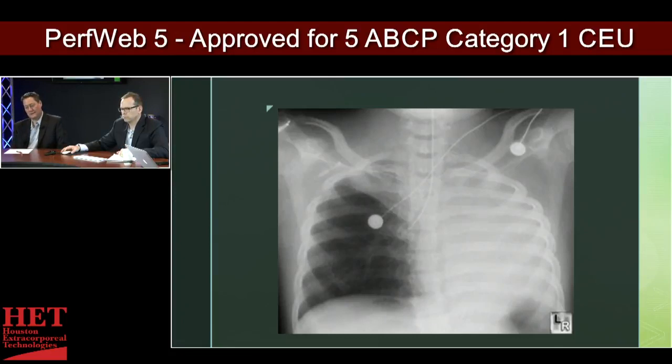But it doesn't look like a lung. I see no outline of a heart at all. I see no outline of a lung. So I guess this is an edema situation, but only on one side. It's a very odd X-ray. A lot of different things going on. You see the patient's arms are above their head.